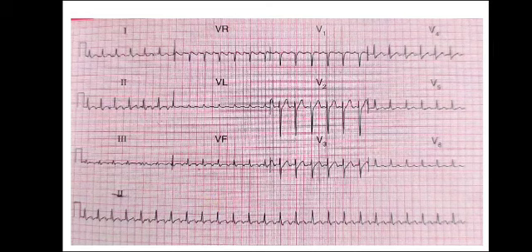Sometimes, I personally feel it difficult to pick atrial flutter. I don't know why. When you read about atrial flutter, the ECGs that they provide are very easy to get the flutter waves on. But the thing is that in real ECGs, it is very difficult. For me personally, it is very difficult to identify the atrial flutter.